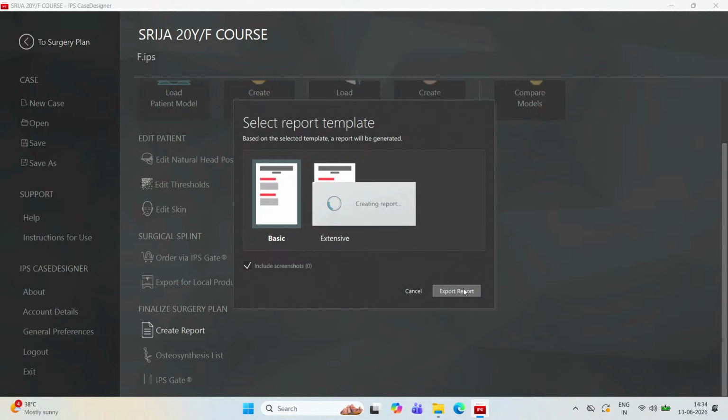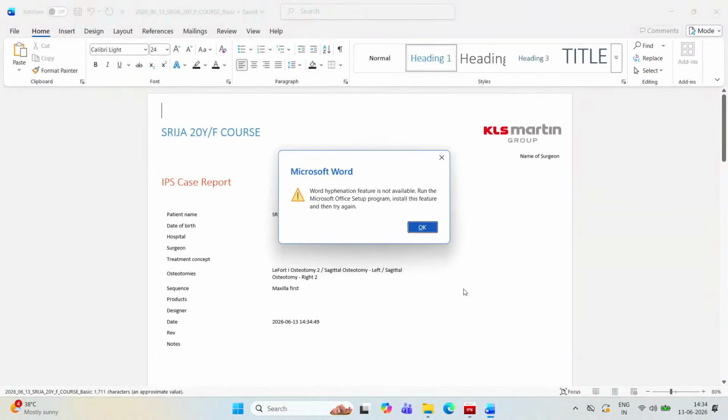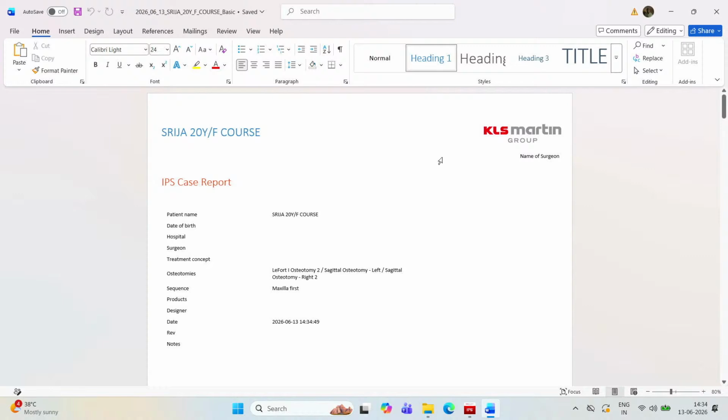Now we are done with all the steps. Probably we'll take another half an hour for all of you to finish with all these steps. And when we are done, if we still have time, we can try out another case as well. We'll give you the data and we would want you to try it out. And if you have any issue, we'll come there and help you out.